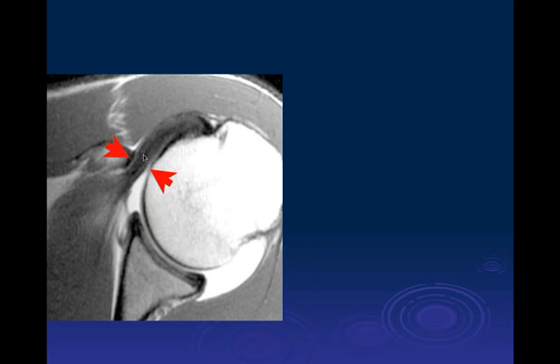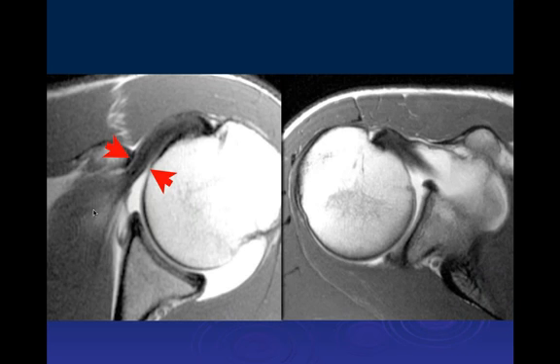There may be a little bit of deformity of the subscapularis muscle and tendon from the positioning of the coracoid process here. And this is in contradistinction to more of a normal appearance, where we can see the coracoid process is quite a ways away from the humeral head in the axial plane. So I think this is the best way to determine this. And on the PD fat-sat images, if you have true coracoid impingement, you'll often get edema within the tendon in this location as well, which I think can be helpful. So it's kind of normal on the right, abnormal on the left.